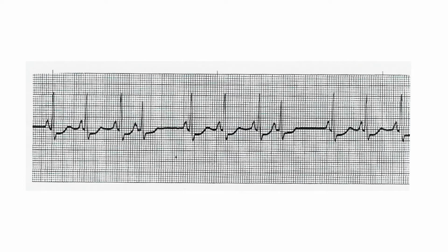7.3 on page 103, on page 104. In this rhythm, if you look, you have a PAC here, and you have a PAC here. You have a P wave, you have a QRS, and in this, you have it every 4th beat.